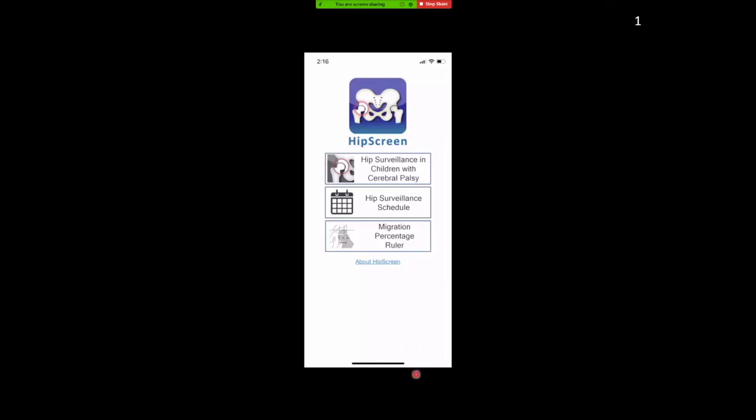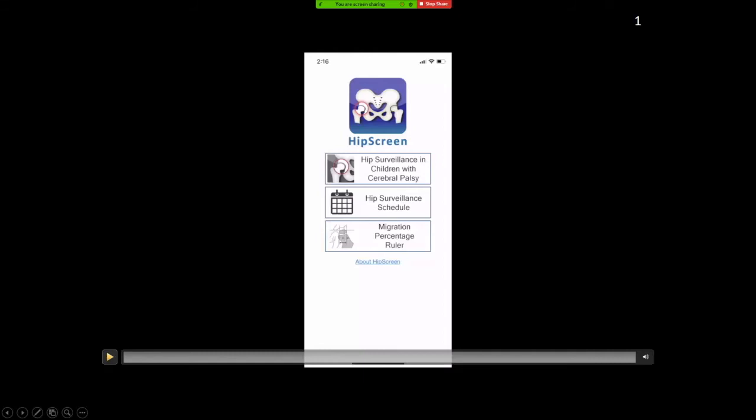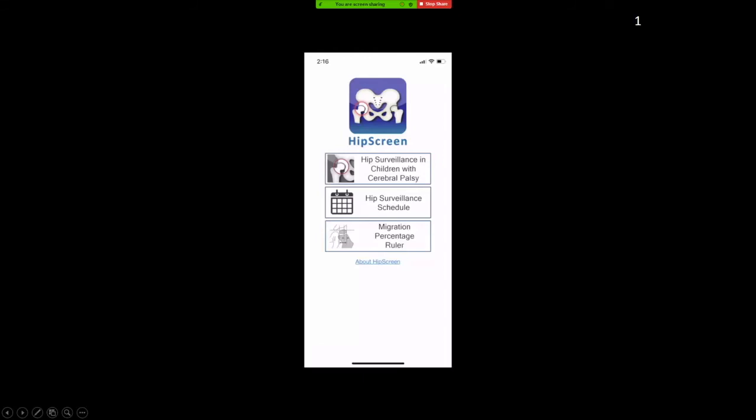So here's the live version of it. Okay, so we're going to do it in real time. So we'll choose migration percentage ruler. Press the camera button.